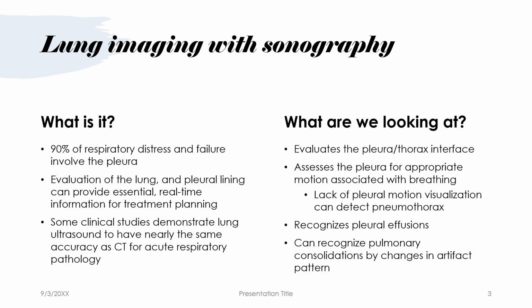Another thing that we can see here, which is actually not artifactual, would be a pleural effusion. So pleural effusions are fluid, or blood, and either way they're going to appear as an anechoic filling of fluid, and because fluid is well visualized under ultrasound, we can just simply look in that pleural cavity and see if there is fluid there, and then evaluate from that point.